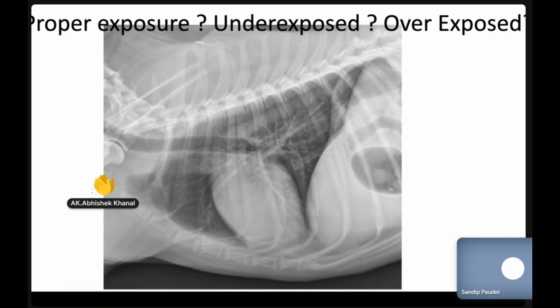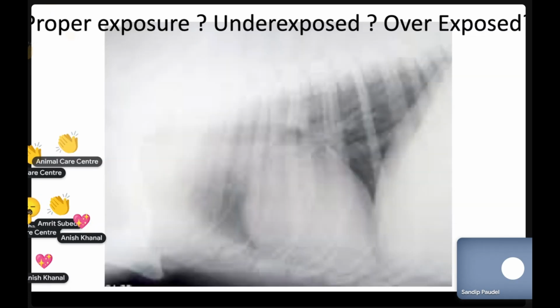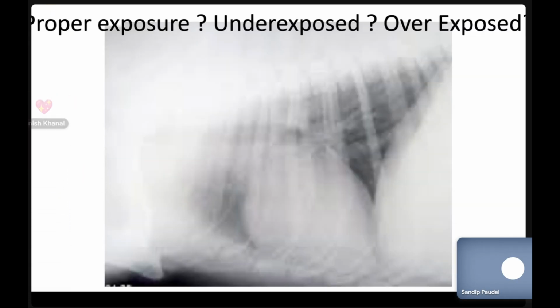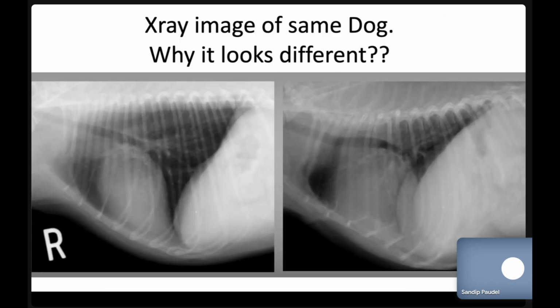Now we can clearly see. If we look here, we can't see the whole thoracic cavity. Only a little bit of the heart area is visible. Here we cannot see properly. Now it should look like this. Again, I'll be stressing the blood vessel supply all the time. I hope you won't get irritated, but this is very important. So try to see the vessel supply in this image. It's a beautiful vessel supply we can see.